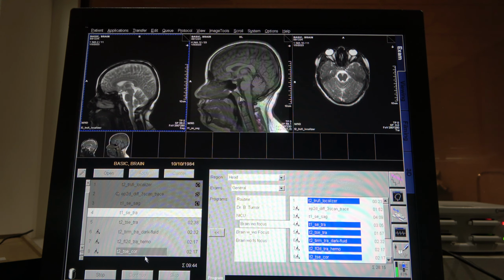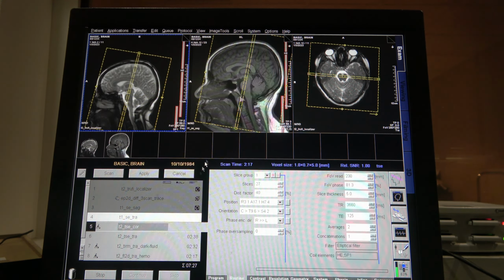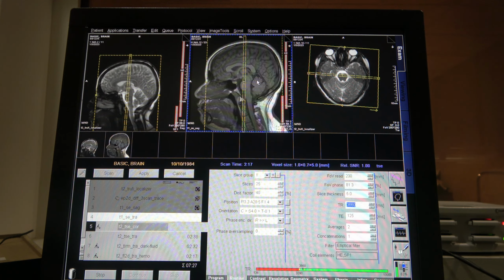Okay. All right. So we're gonna bring this coronal up next. We're just gonna grab it with your left click all the way up, holding it and dropping it. Remember, to open it is double click. Now here, same thing. I'm gonna angle and I'm gonna bring it down. So it's kind of like the same as your sagittal, okay? And once again, we want the whole brain. This looks like there's more than just the brain. So let's take away some slices. There you go. All right.